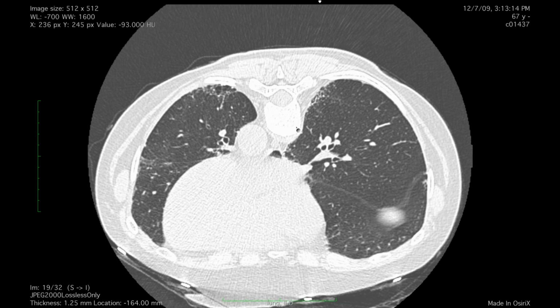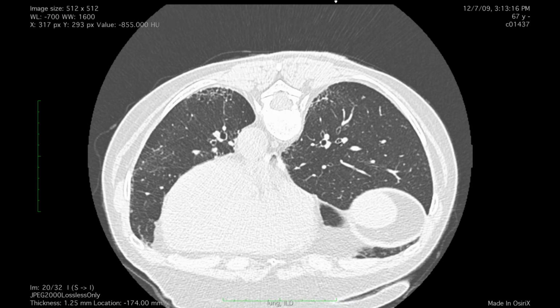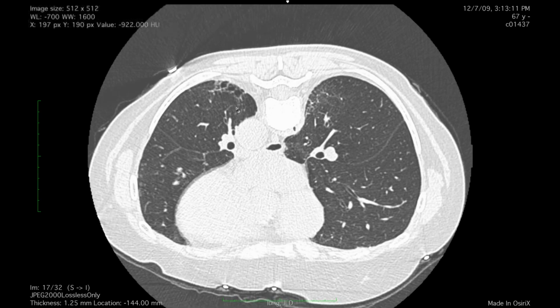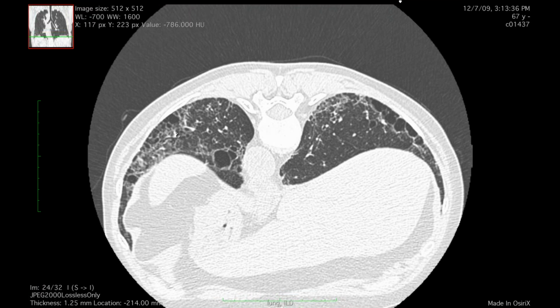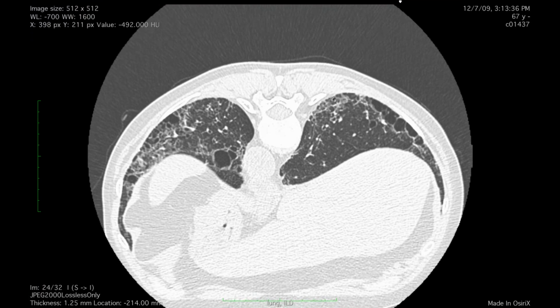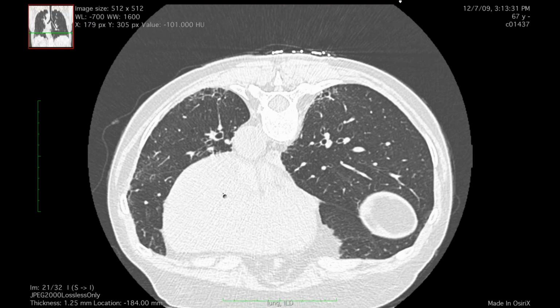Oh, I was going to say, it's just odd in a non-smoker. I don't know how to explain it, but yeah, some inhalational injury did the same damage. Yeah, they just said a very significant secondhand smoking exposure. So I don't know, but I think the point is too that not every cystic space is honeycombing, and I'm glad you guys agree too that these bigger, just bizarre spaces aren't. And of course, in this case, it makes a big difference because she doesn't have UIP or IPF, at least based on this alone. So, Travis, do you think she could just be a really bad aspirator?